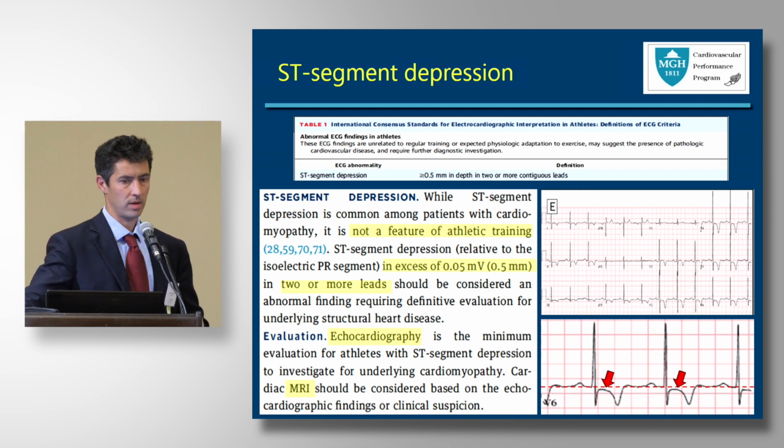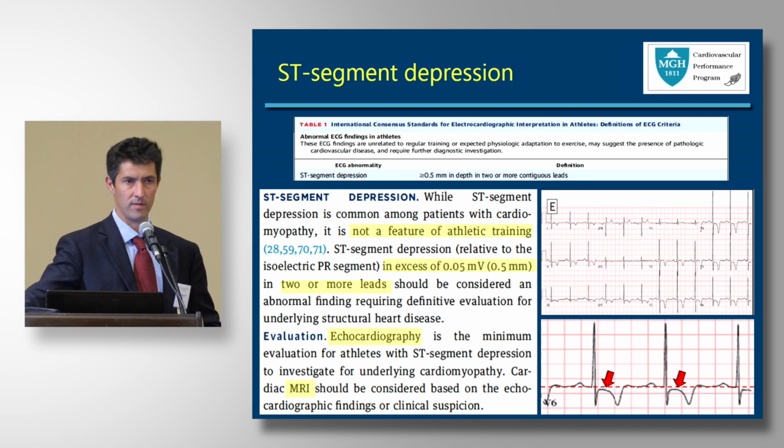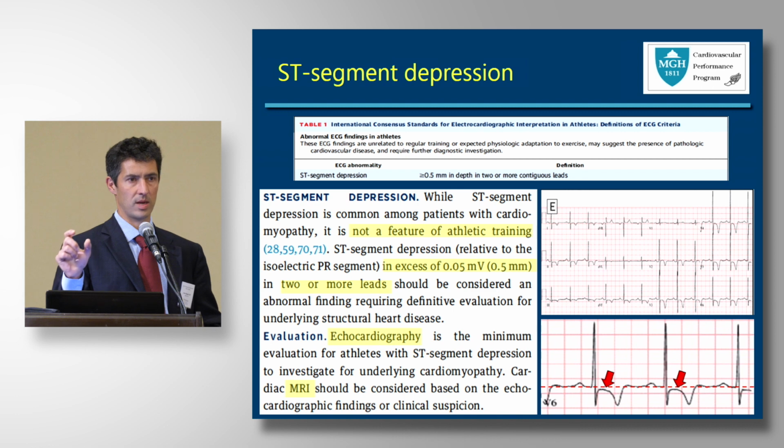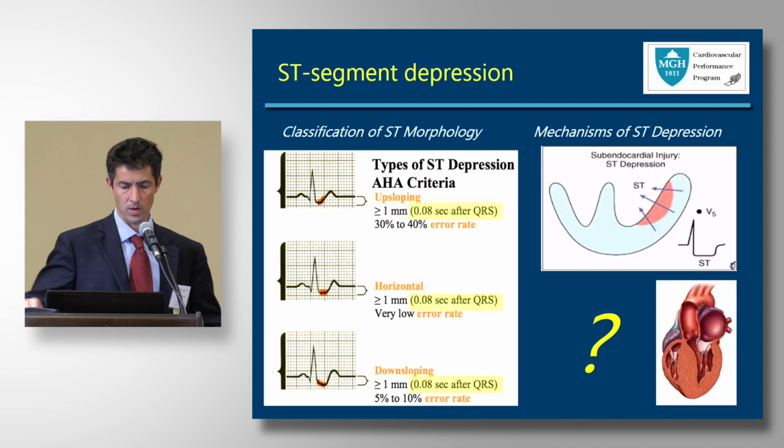Here is the example of ST segment depression as pulled from the paper, and you can see here blown up on the lower right of your screen what this looks like. I've drawn a red line across the isoelectric baseline, which is defined by the TP segment, so the segment in between the end of the T wave and beginning of the P wave, the electrical time of silence that separates cardiac impulses, and then the ST segment here drops below that line in this example in V6.